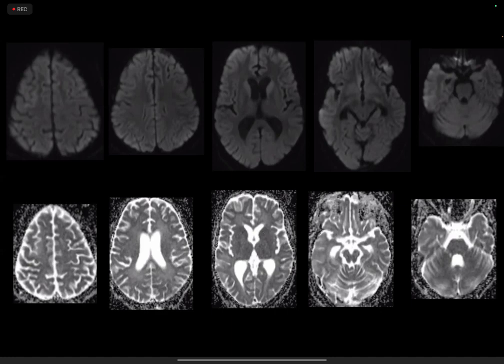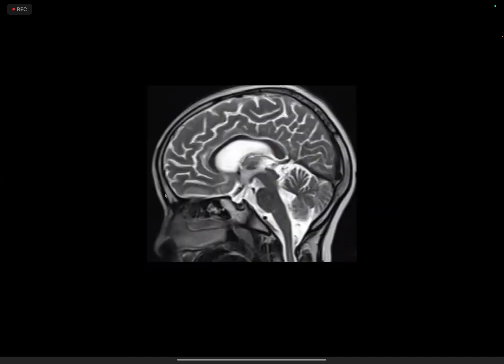So a mixed pattern of edematous changes, especially in the cortex and the anterior basal ganglia, with a background of volume loss in the supra and infratentorial compartments. I have a sagittal midline image, again demonstrating the atrophic changes in the corpus callosum, the vermis, and the supratentorial structures.